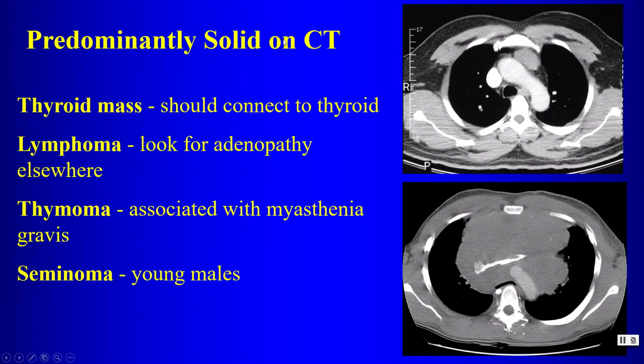If we're dealing with predominantly solid lesions, thyroid mass should connect to the thyroid. Lymphoma, look for lymphadenopathy elsewhere. Thymoma, associated with myasthenia gravis. Seminoma, this occurs in young males. Here's an example of a thymoma. Here's an example of a seminoma in this young male.